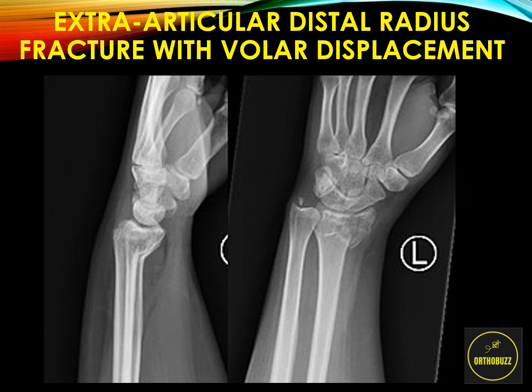As we can see, we have extra-articular distal radius fractures, and they can either have dorsal displacement, which is the most common type, or they can have volar displacement in this case. These are more unstable injuries, as the flexors are stronger, and will always want to flex this and displace the fracture fragments. And therefore, more often than not, these will need to have an operation, similar to the one with the plate and screws in the image before.